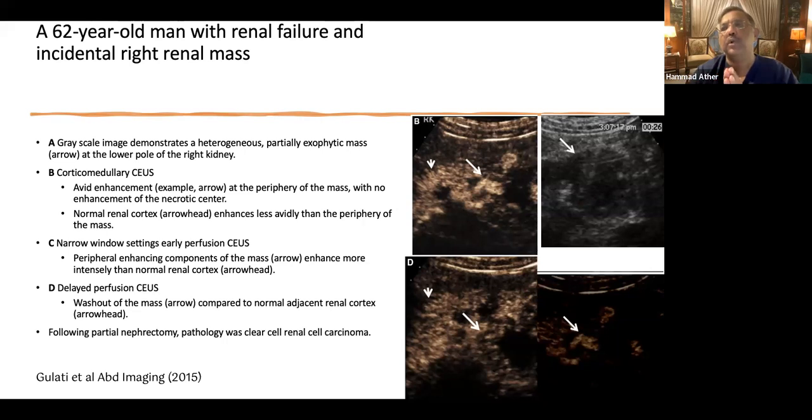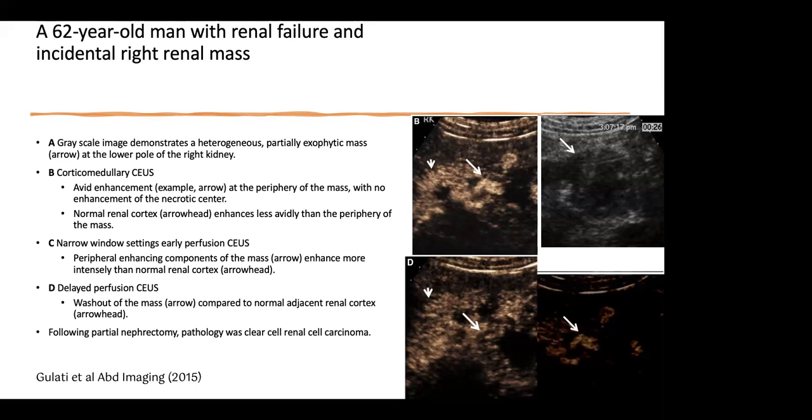So the washout of a tumor is more rapid than that of the renal parenchyma. Yes. That is a feature which makes it a confirmation of the abnormality that we are suspecting to be a real abnormality, and makes a tumor more of a possibility. Thank you.